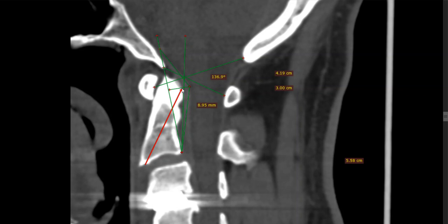And that can also add more tissue here, and it presses into that, and therefore you also get what we see here, a low axial angle. This number should be in the mean of like 145 to 1, well, not the mean is 140, the mean is 150. So the lowest is 145, and usually once you start dropping underneath 145, then it's just a sign that something's going on, but does not mean there's a problem.